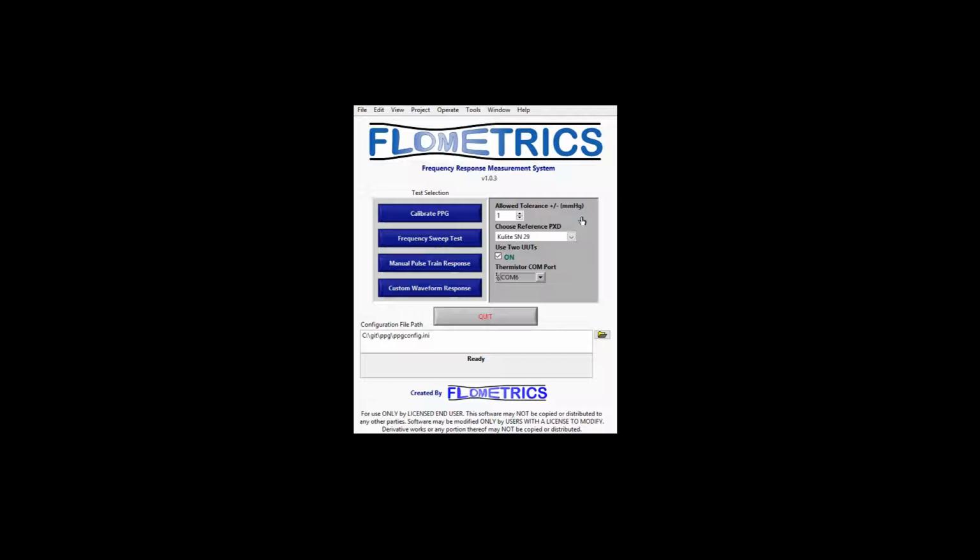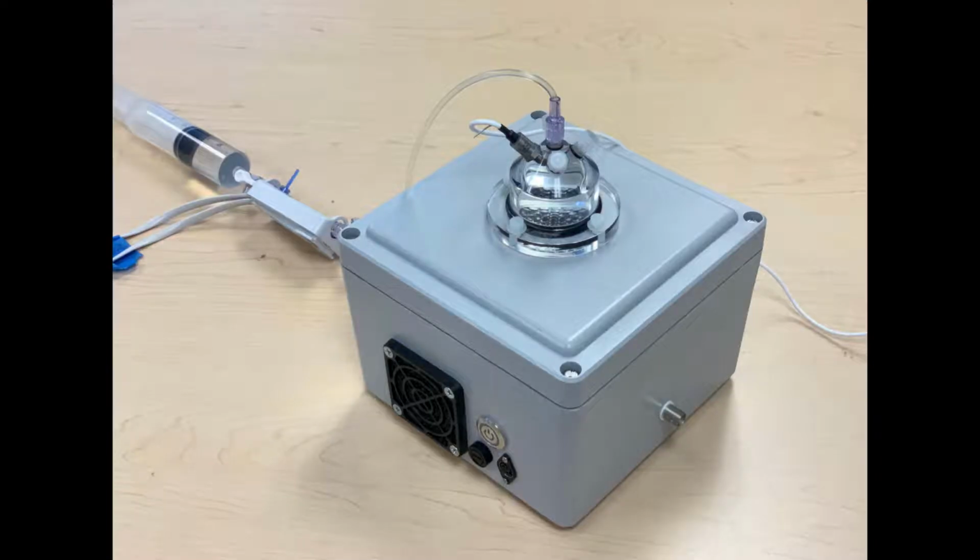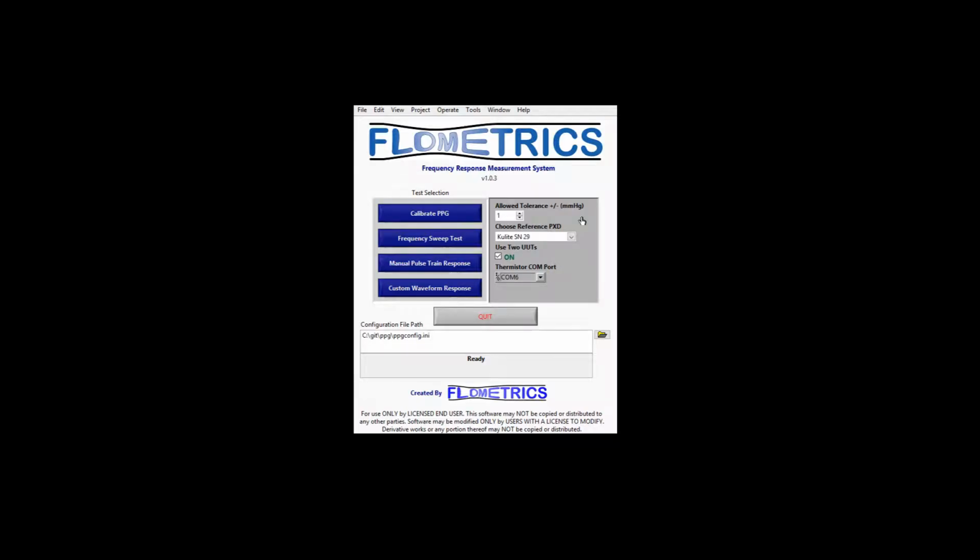Calibrating the PPG. Before using the FRMS, the pressure pulse generator must be calibrated. During the calibration process, the FRMS software outputs a series of constant voltages to the PPG. The reference transducer attached to the PPG measures the pressure in the chamber, and a curve mapping pressure to voltage is generated and stored within the software. The calibration process should be performed every time the FRMS software is started and periodically throughout testing.